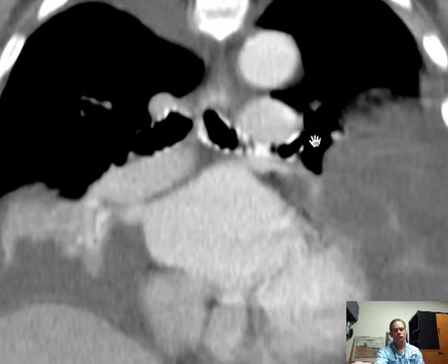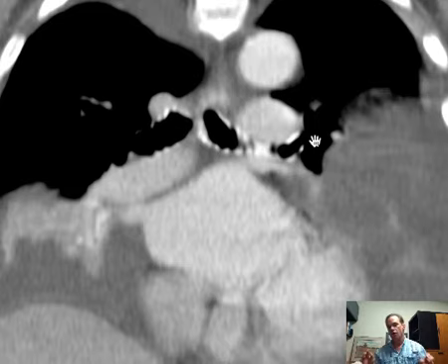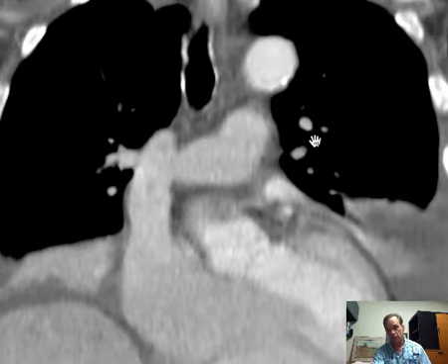And you can get this with COPD, where there's destruction of lung, which then, of course, will leave you fewer and smaller pulmonary arterial branches in the lungs for all of that amount of blood to go through. Why does it have to go through?